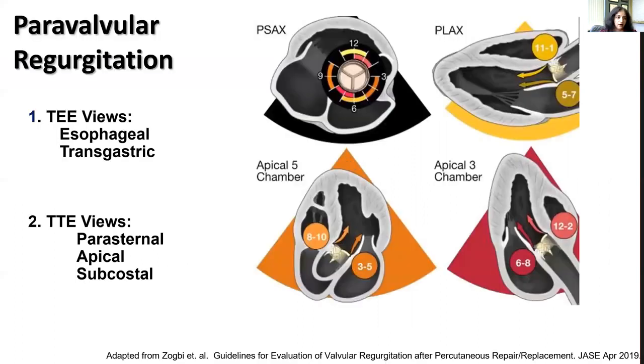And the final part of valve deployment is really paravalvular regurgitation. Why do we care about PVL? Well, PVL is an important marker of morbidity and mortality in TAVR, and really understanding and minimizing PVL before the patient leaves the cath lab will predict their long-term outcomes.